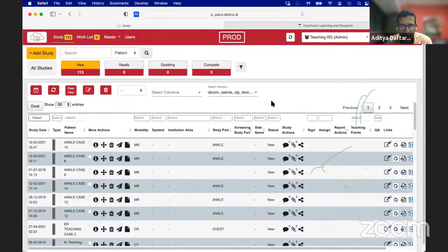When describing pathology, describe the sequence a bit. In general, when we're talking about pathology, 99% of the time we'll be talking about a proton density image if it's not black, and if it's black, then it'll be a T2 fat suppressed or an inversion recovery sequence.